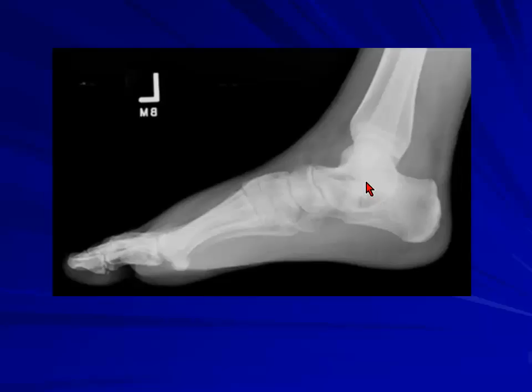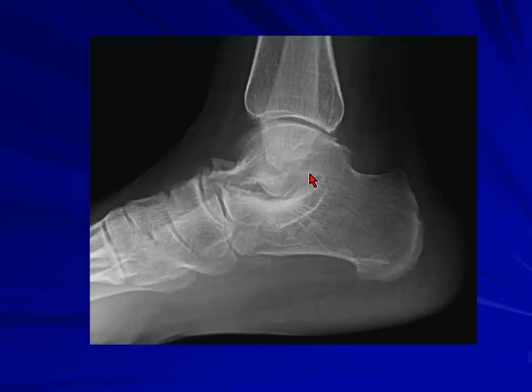It's not clear, but when you are looking at the CT, you need to look at whether there is fusion. Fusion could be bony, could be fibrous, it could be mixed. If you've got solid fusion, bones are fused, probably this one is bony fusion, that's why you see it on X-ray. It's calcified, so it's solid fusion. But if the patient comes back and the clinician says there is still pain, this could be congenital or this could be surgically introduced because of the persistent pain, and they fix it and fuse it. So this is what it is.